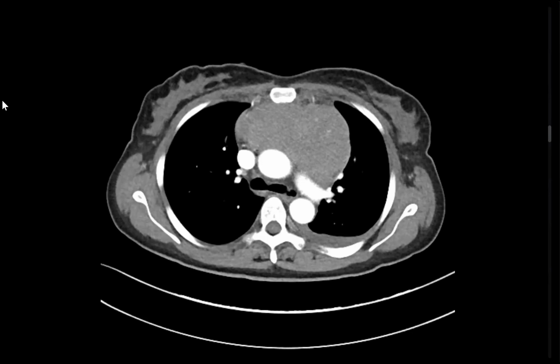Histoplasmosis. Okay. In such a case, can you name the pathology? If you are suspecting histoplasmosis, what is the calcified mass in the anterior mediastinum?